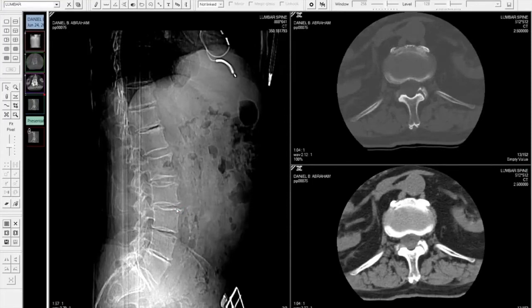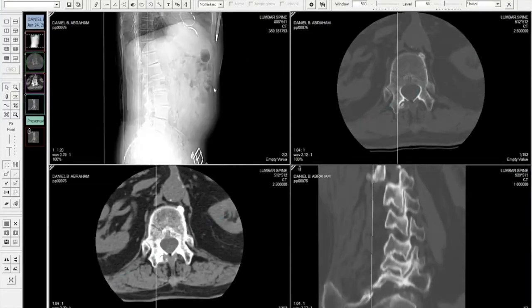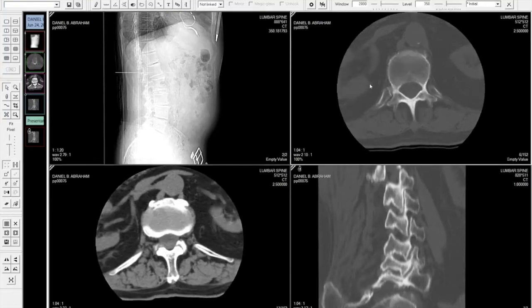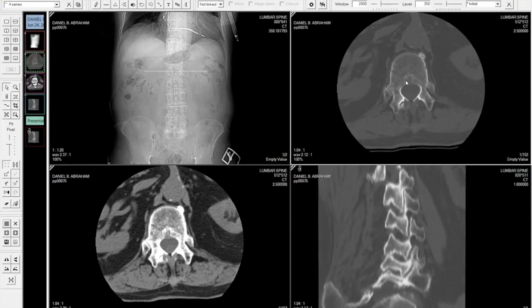Now, this is a pretty good example of a hanging protocol because it contains a lot of variables. And again, you don't want to use the technology to make your life harder. It's just if things are simpler, use the technology. Now, if you look at the study, the localizer on the lateral view was light. They acquired the axial images in 2 different algorithms. And if I choose to, I can just do a simple 4 series and everybody's happy. I can read the exam that way, not a problem.